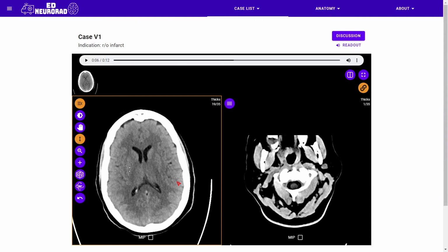The main part for this case is to look at the follow-up portions of the case. And you can see here that the red arrow is where I'm at any point in the readout. You can use this slider to go to different parts of the readout.